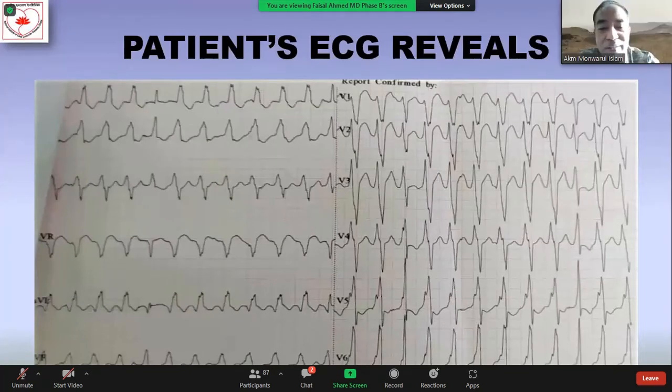Okay, this is good, but I think in this particular ECG, features of AV dissociation are not so obvious because P waves are not so easily demonstrable here. But sometimes in ventricular tachycardia, P waves can be seen, and there is no relationship between the P wave and the QRS complex. In that case, it is very easy to diagnose the AV dissociation. And here, the presence of capture beat, sinus beat, these beats are easily visible.